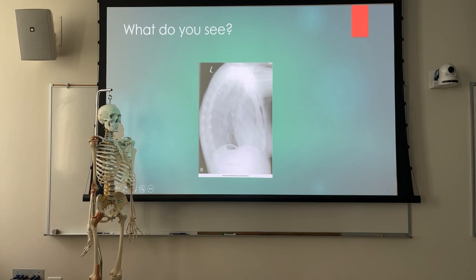But take a look at this patient, and you know they're pretty kyphotic, right? So it's probably an older patient, maybe as high as they can get it. You can probably get rid of some of this rotation, but they may not be able to get their arms up higher than that. So every potential positioning error comes with the understanding that it's patient determinant, and not to armchair quarterback everything in some of the images that y'all send. I wasn't there with the patient, so I don't know what the patient's condition was. So I'd probably repeat that.